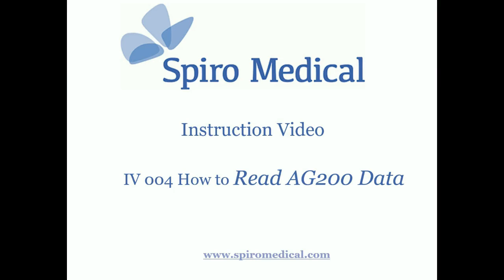My name is Wolf Hansen from Spiro Medical. I'm now going to show you how to import ApneaGraph AG200 data to the new ApneaGraph Spiro analysis software.